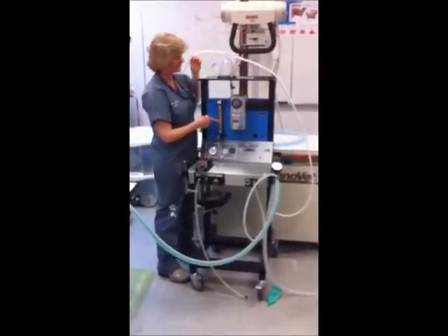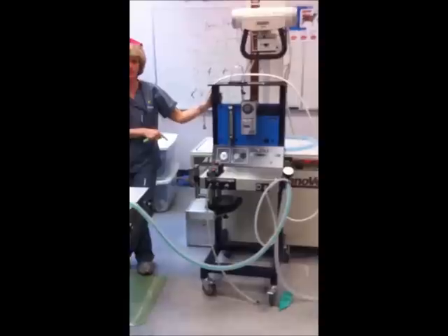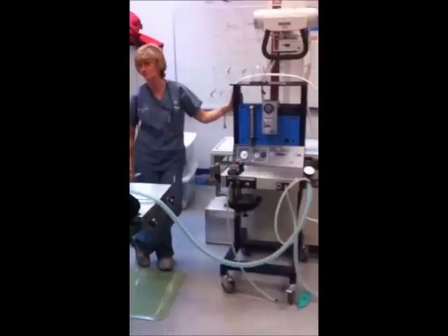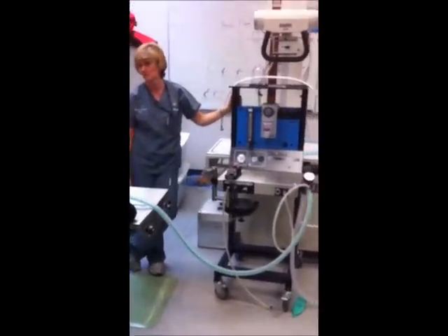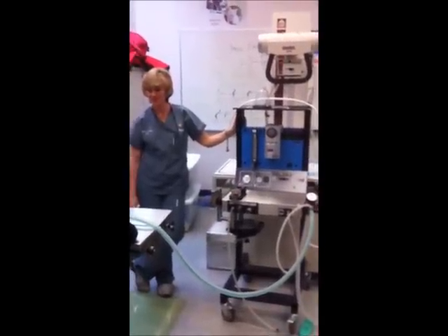Are you gonna ask us, like, if we have to bag the patient? I won't ask you about bagging a patient on your practical, but there will be questions on the written. I just finished doing the written test today, so I know there's a question or two on that. So understand why you're doing it and how to do it. Does that help? Tara?